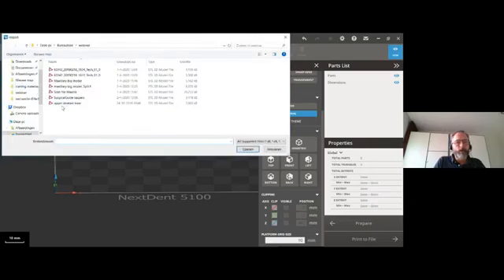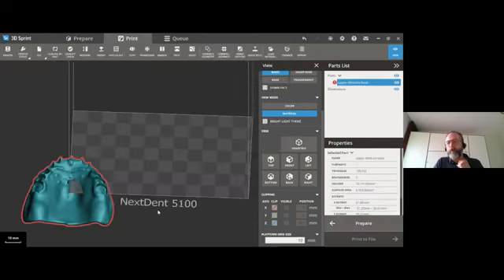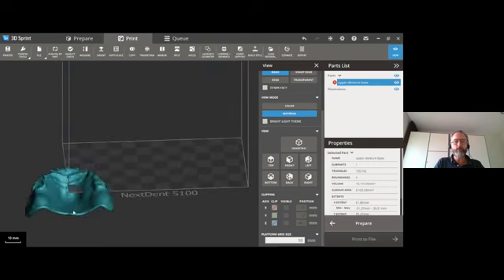Very popular today is actually also printing dentures. So I would like to show you the orientation that we at the moment feel is the best, because we have two critical areas. We have, of course, the tooth fitting surface, and we have, of course, the surface that fits to the gums.